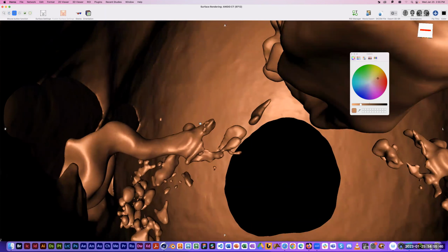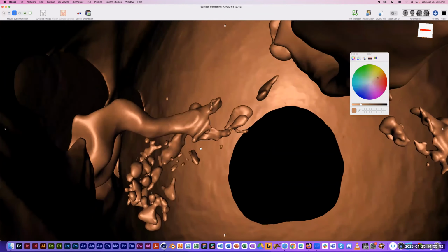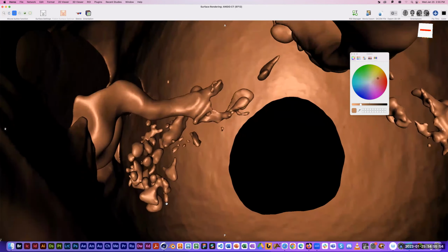And then this is all the middle ear cavity, where the bones and things are, the ear ossicles. All these little blobs down here, these are what are known as the mastoid air cells. The mastoid is filled with little air sinuses. So you can see all of this stuff.